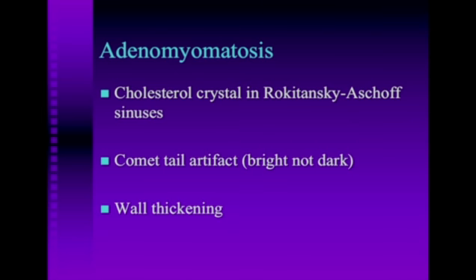The ring down is due to misrepresentation of the depth due to a time delay as the sound wave reflects or rattles around in a cholesterol crystal within the Rokitansky-Aschoff sinuses. This way the sound is actually registered in a deeper location, and it's a very clear, easily identified diagnosis. There can be focal wall thickening, and in those cases it could raise the question of a gallbladder cancer, but again, these should be benign, and we would hope that they would not have to go to surgery.